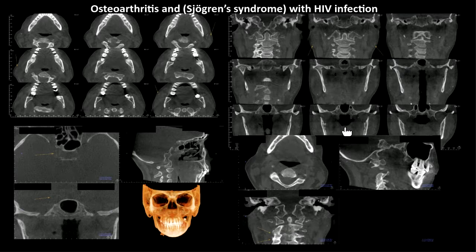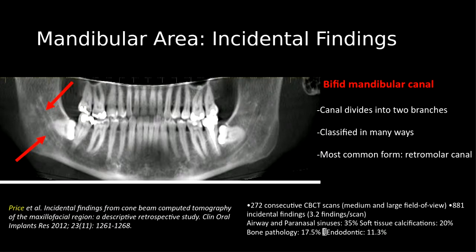And in the same patient, you can see the spine. The spine is not symmetric. It looks more asymmetric. There's flattening, sclerosis, and a bird beak appearance in that area, and reduced joint space. That means the patient also has neck pain and TMJ pain. So we diagnosed this patient as going more towards an osteoarthritic case. And this patient is undergoing treatment and doing pretty well, based on the previous conditions and everything.